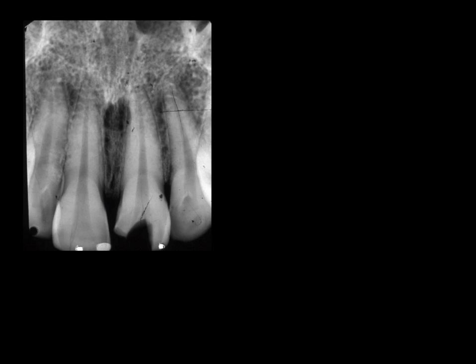But parallax is widely used by dentists, and this is a more sophisticated version of using two images. I'll give you an example to try and explain the principle. This is a radiograph taken straight down the midline of the maxilla. I've actually taken it on a dried skull, so the image looks quite high contrast compared to a real patient, where soft tissues tend to make the image rather grey. In the midline between the two incisors, you can see our old friend, the incisive foramen. And we're going to use that as an example to try and prove parallax to you.